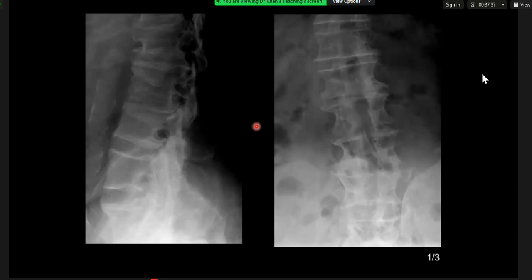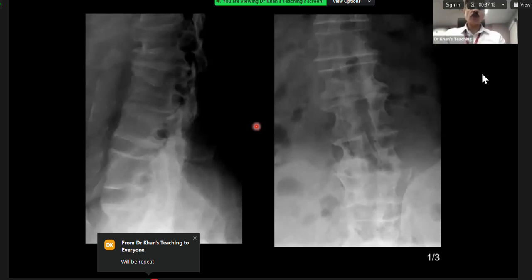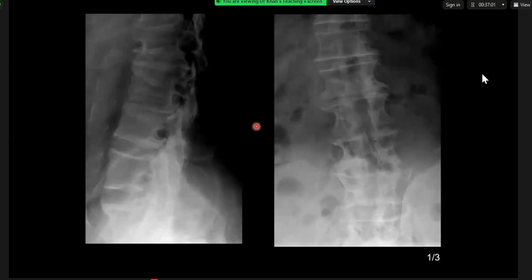So in summary, there is posterior vertebral body scalloping and likely a secondary deformity in the alignment of the lumbar spine. My differentials for this would include a neural-based pathology such as neurofibromatosis. Okay, so can I stop you there? So you are considering neurofibromatosis because of the posterior scalloping, fine. But let me give you a hint. Look at the pedicles. So they're thinned, or flattened rather. Something else.